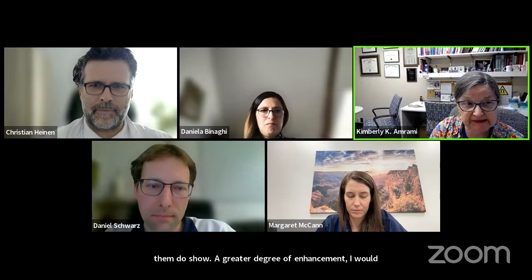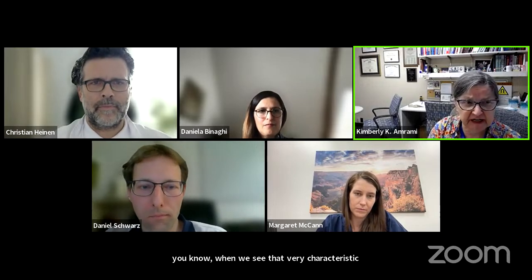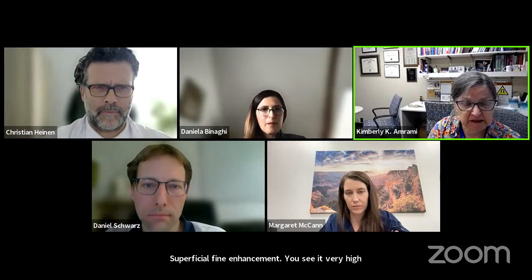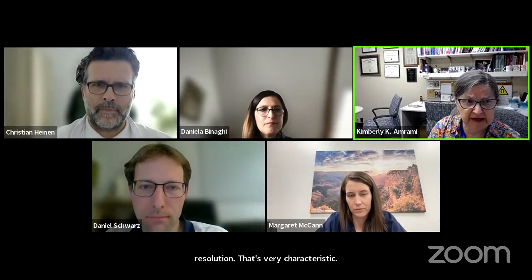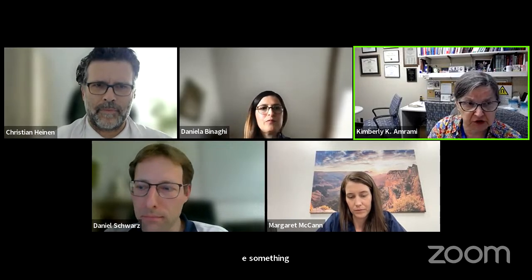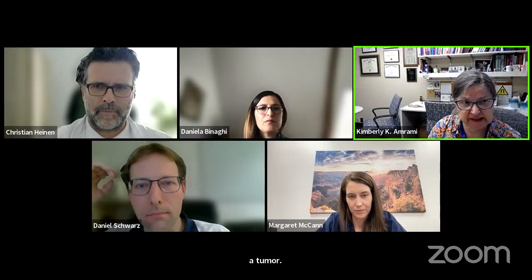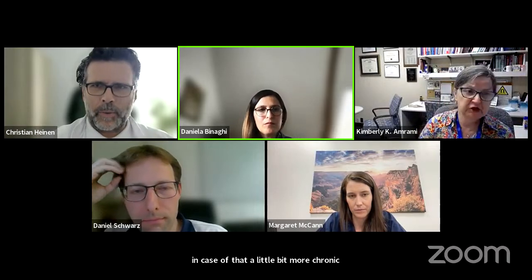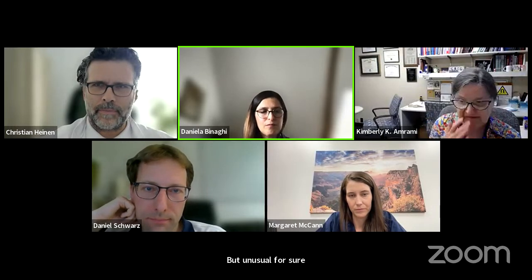I would say it always makes us a little bit less sure when we see that very characteristic superficial fine enhancement at very high resolution. I'll get a little bit worried about something else, something infiltrative like amyloid or sarcoid or even a tumor. But we do definitely see it, and I would say often it's in cases that are a little bit more chronic. Okay, but unusual, for sure. Yeah, very unusual. That was the first time I saw it.